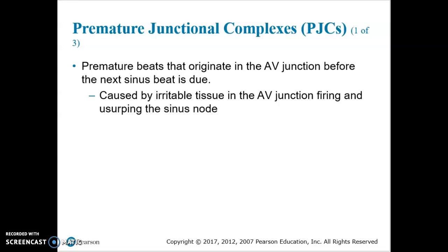Chapter 9, Video 2. In this video, we're going to begin with talking about premature junctional complexes. Premature junctional complexes are also known as PJCs. This is simply a premature beat that originates in the AV junction before the next sinus beat is due, okay?